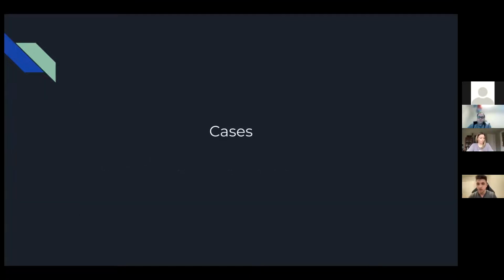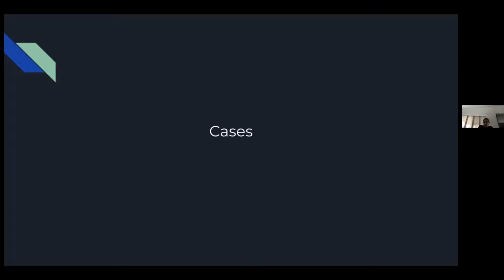Okay. So we've gone through the literature, we've gone through how to actually do VExUS. Now let's actually apply it to some cases. I've done my best to pick out some cases where I thought VExUS was more key in terms of being the step in clinical decision-making, but there are certainly some caveats, as you'll see.